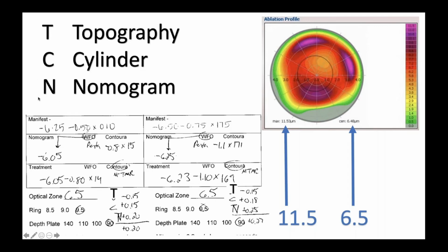And then finally, we all know from doing LASIK that the higher amounts of myopia that you treat, you have to apply nomograms so that you don't overcorrect that cornea. We have a proprietary nomogram that's built in. So when Phorcides gives you the answer and tells you the sphere, cylinder, and axis to treat, this sphere has already been calculated with a nomogram.